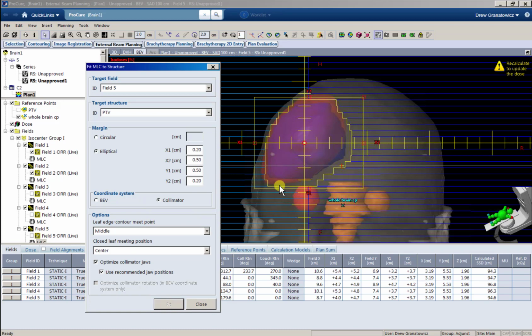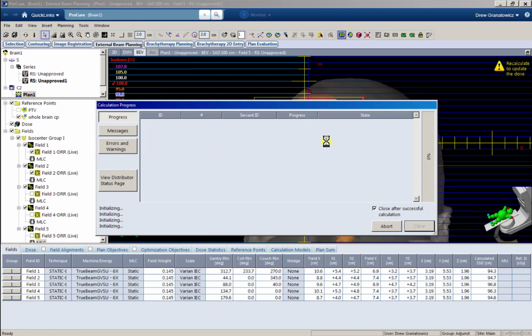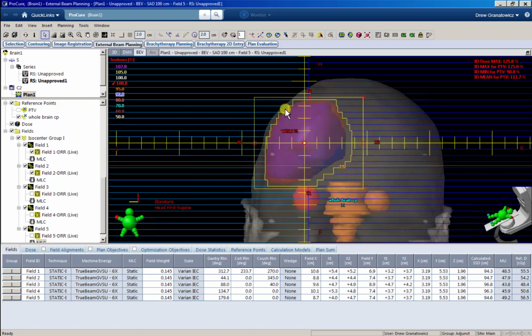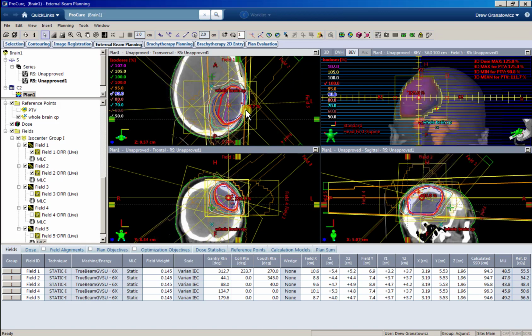Again, manually, we could do a little bit better job. But I'm just showing you another method, and usually doing that is gonna be good enough. But if you really want to come up with the best plan you can, really high quality, very, very conformal, you can manually adjust those, just like I do in class. So if you forgot how we did it in class, go back in class. You can use that same method here. We just go around and do a couple rounds, couple circles through your blocks, and adjust them accordingly. Come up with a very, very conformal plan.